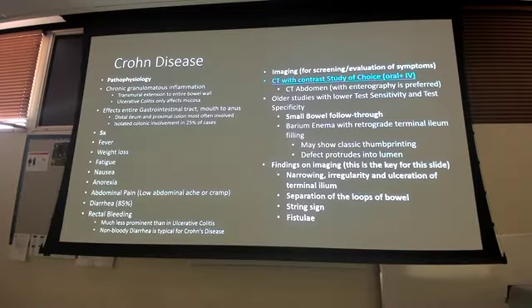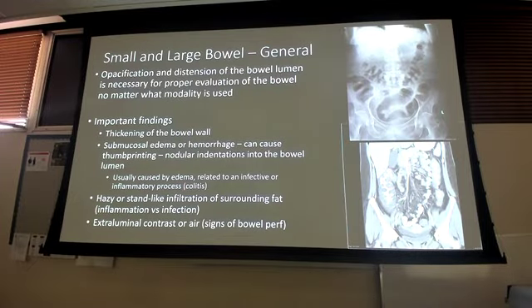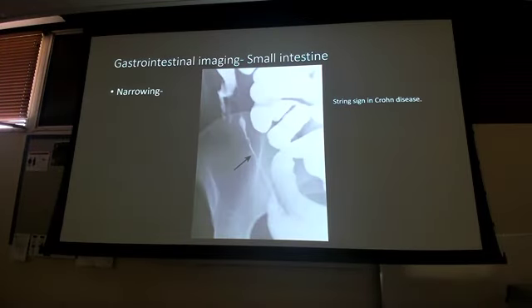Going back to this CT picture, and again, I know it's large intestine, but you can see what I'm talking about. The concept is still here. The walls of the intestine get so inflamed that it compresses things in general, and that's what's causing the string sign for your Crohn's disease. Okay? Does that follow? Does that pathophysiology make sense? I know you haven't had GI yet, so I'm trying to find a way to kind of give you the foundation so you understand what's going on.